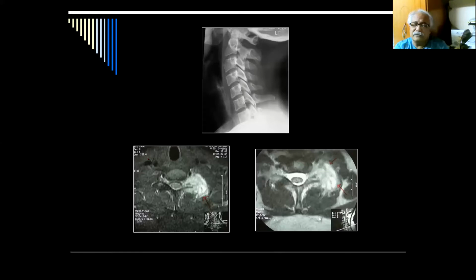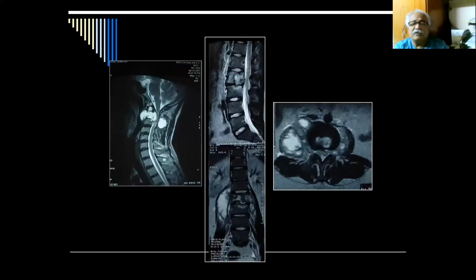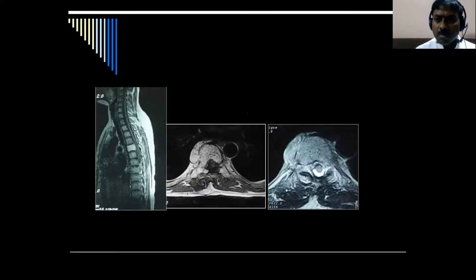Sort of infective changes, or suppose you see, even you can find this sort of shadow, and suppose this is the vertebral body, and you can see there is a lot of destruction like this. And how do you know that this is tuberculosis? Because this is theory, probably everybody in your undergraduate also we have taught you that if you see destruction of the vertebral body close to the disc, probably you will find that this is because of tuberculosis or infection. But if it is central in the body, you have to be very cautious. Probably you are not missing any tumor or any metastasis.